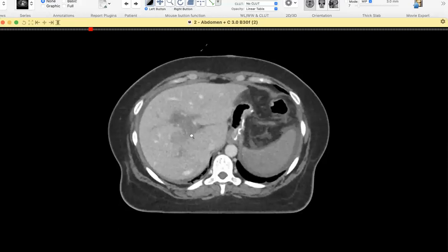Repeat 13 mm, please. Okay, so this is for appendicitis. Appendicitis, the caliber from 7 to 13 mm is appendicitis. 13 to 15 mm, it can be either appendicitis or appendicular mucocele. More than 15 mm, high specificity and sensitivity for appendicular mucocele.